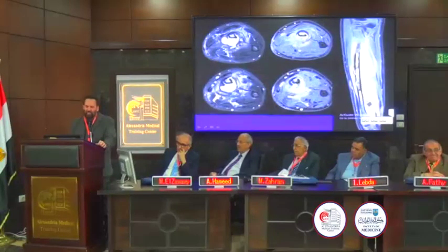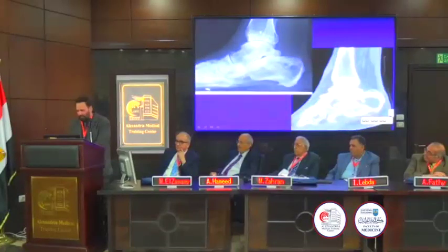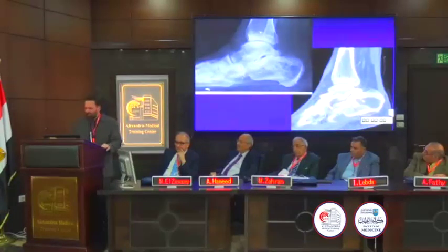So here's a subperiosteal abscess, a cloaca, more than one cloaca, and chronic osteomyelitis. You'd be suspicious that there was a sequestrum here. I don't remember, to be honest. Chronic osteomyelitis of the calcaneus. And what do we see centrally within this? Sequestrum. And the importance of sequestrum is it's a petri dish for the bacteria. It's putting out their favorite food to eat, and as much as they want to eat, so they're never going to go away. So you've got to take out the sequestrum or the infection will never resolve.